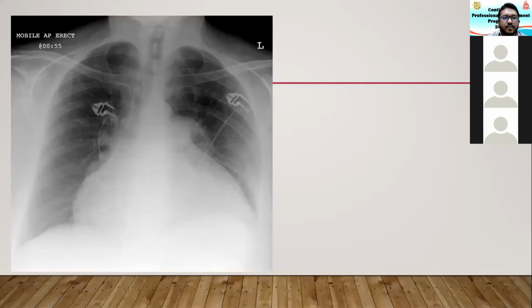Usually the heart is a mobile structure, which is having all the contractions, because it's not a static structure. Usually you don't get a very clear outline because of the multiple contractions during the X-ray exposure. But if something is happening there and slowing down, or the movement of the cardiac contraction is not transmitted to the pericardium, then you will get this very sharp edge of the heart. When you have a globular-shaped heart with a very sharp outline, we have to suspect a pericardial effusion. So that's how you diagnose a pericardial effusion.